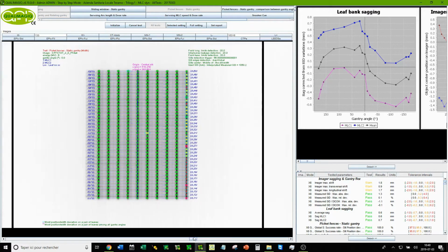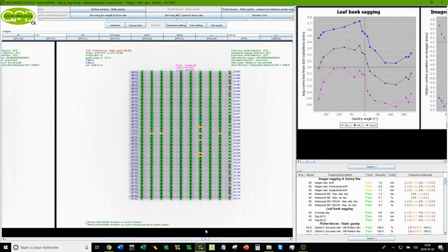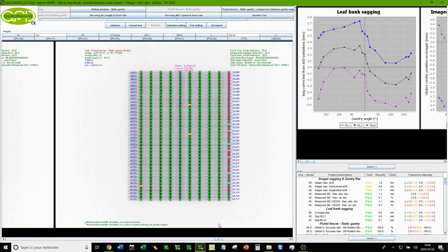for the last slit for 0.2 mm tolerance. Slits positions are still okay. The problem with widths for the last slits begins to rectify with a gantry at 270 degrees, but comes back at gantry at 180 degrees. It's not too bad overall, with a static gantry with 0.2 mm tolerance on slit position and width.